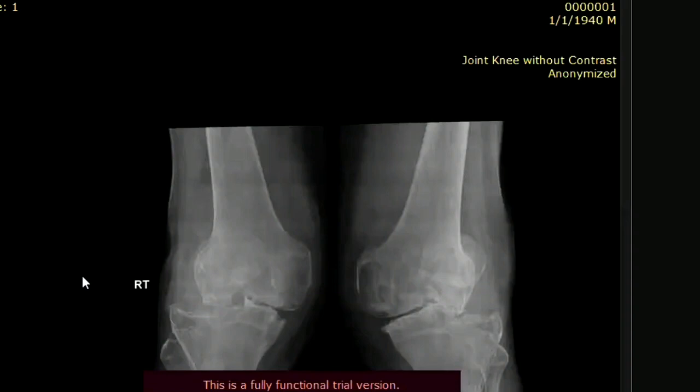Okay, so you have given two differentials. Yes. So, Dr. Rubab, do you want me to explain each X-ray, or do you have some particular methodology which I should follow? Is it fine if I give tips and points at the end, or after every case? Yes, after every case, I think you should be discussing. Can I request someone else to describe the same X-ray?